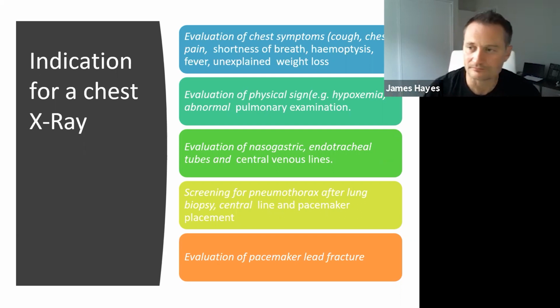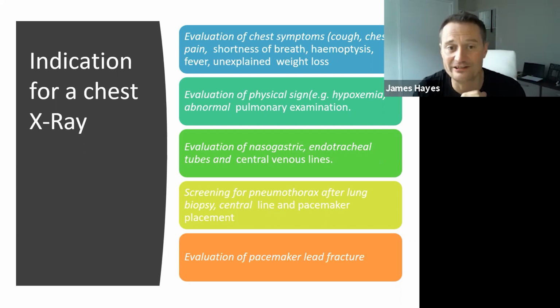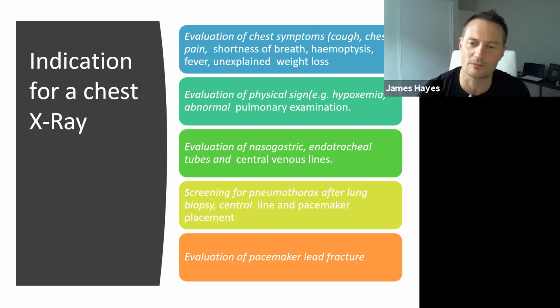Okay, I'll move on to chest. So why do you do them? The chest x-ray is the most common thing in the x-ray department, and it's kind of the barometer of the entire body. If there's something wrong with you, it's going to show up in your chest. Your lungs won't look as inflated as they should. Your heart might be big. If you're coughing blood, that'll show up as white streaks in your chest.